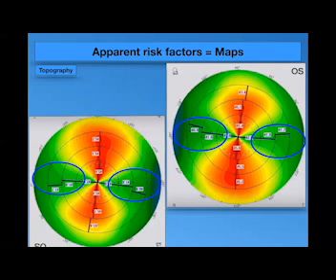Again, if the superior point is less than the inferior point by 1.5 or less, it could be accepted, especially if there are no other signs in the coming maps and slides. If just this is present, it's accepted to have a difference between the superior and the inferior points of 1.5 or less. If more, you have to suspect.